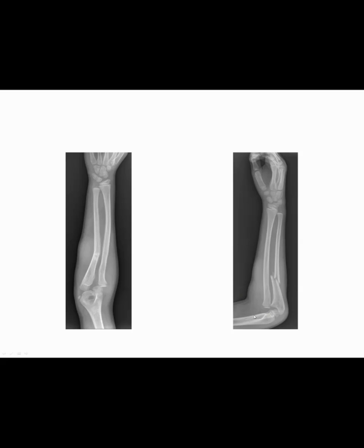Next, we could look for the sail sign. I'm not seeing any abnormal bowing of the anterior fat pad. I'm not seeing the posterior fat pad at all. If this was a dedicated elbow radiograph, we might be able to see it, but as such, at this time, we aren't. And when we examine the soft tissues, we notice this area of increased density here, and this is indicative of soft tissue edema. So again, if something in the ulna here is more subtle, this soft tissue edema could raise your suspicion to scrutinize this area more closely.